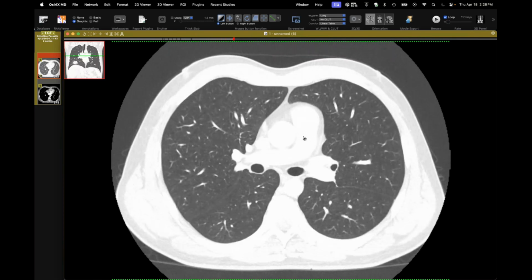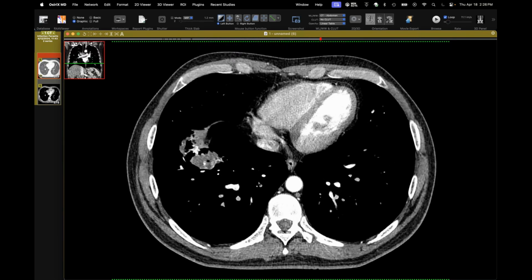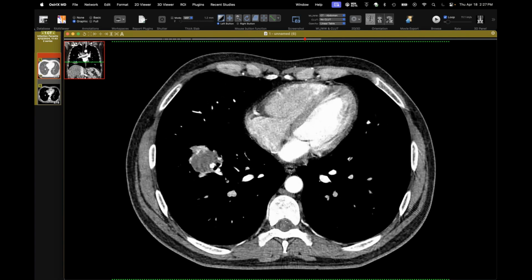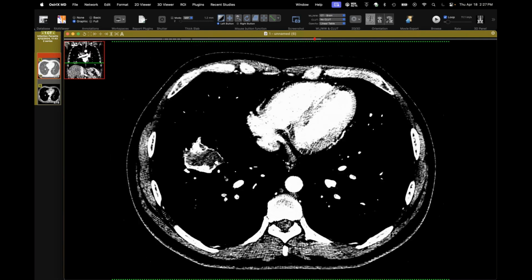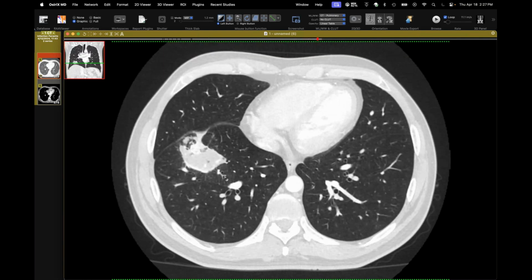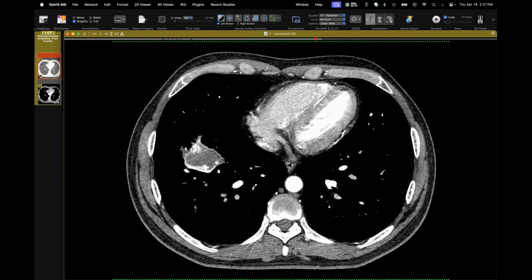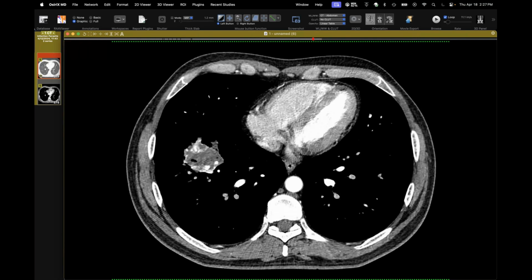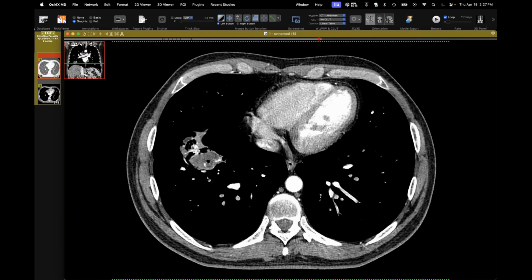But this patient was coughing up some blood. You can see this one down here doesn't look so nice. It's got air in it, and it's got all this dense stuff, which turns out to be vessels running along the walls. The air has to get in there, so it has to rupture into the lung. And we don't see the collapsed endocyst, and normally these are avascular. So what's happened is this one has gotten super infected at some point and probably has a small leak in the lung.